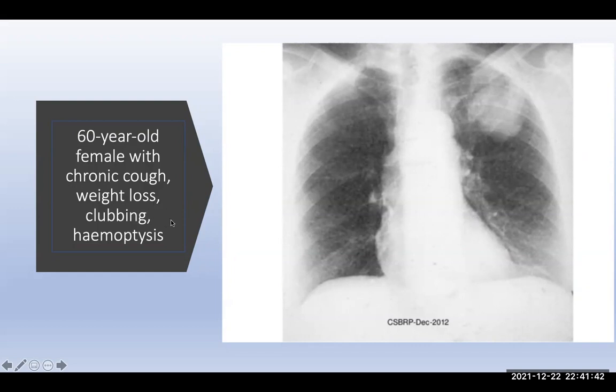So for the GP, what is the important lesson? If you are a GP and you get this kind of X-ray, you have to refer this patient to the higher center. If you say, I'm a GP, so it's not necessary for me, no. When you get this kind of X-ray in your GP center with the clinical suspicion, you always have to refer this patient to the higher center. It will be good for you, as well as good for the patient for early diagnosis.